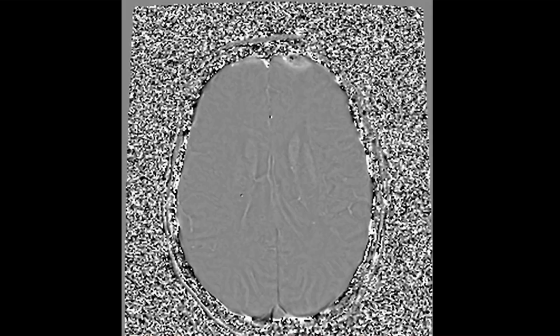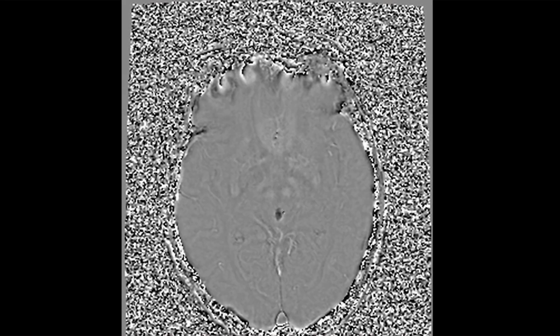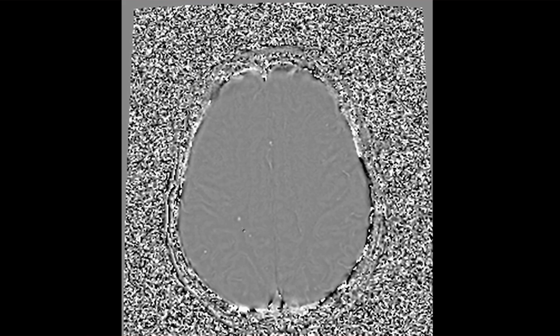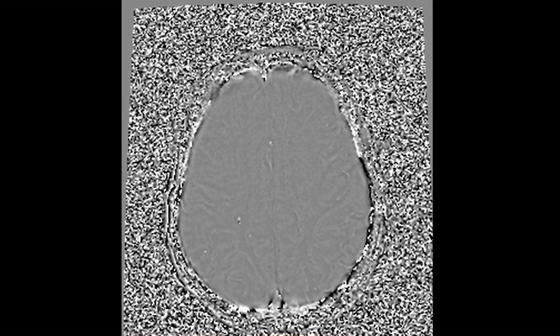You troubleshoot the sequence with this phase. So you have a magnitude and a phase. If you are wondering what constitutes these little areas, you can see what phase this is. This is a bright phase, whatever that is, corresponds maybe to other vessels. You could convince yourself this is probably blood. It's probably not calcium. The skull looks different phase here. So that's the troubleshooting.